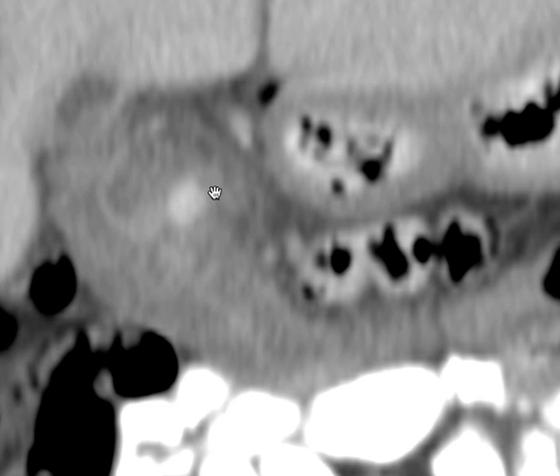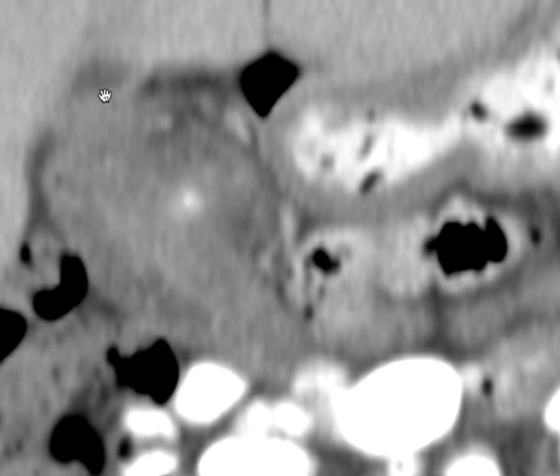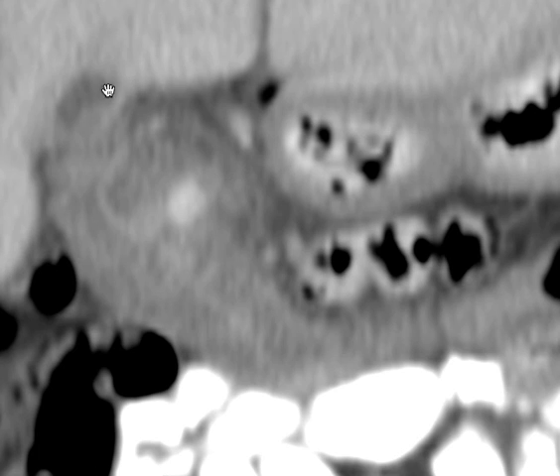So this is a classic diverticulitis. Not the most common location. Left colon, especially distal left colon and sigmoid colon, are far and away more common, but still you can get it anywhere in the colon. So this is diverticulitis. See, the little gallbladder here is kind of squished by this process, but it's also contracted. So this is diverticulitis.